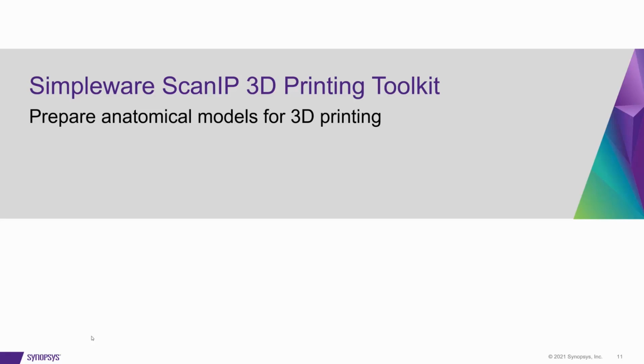So I'm going to run through that toolkit in just a second, but obviously ScanIP is quite a wide-ranging program, and essentially it can take in any DICOM medical imaging and process it through to 3D models and everything in between. So all your visualization, measurements, analysis, segmentation, image processing, all that is included within ScanIP.